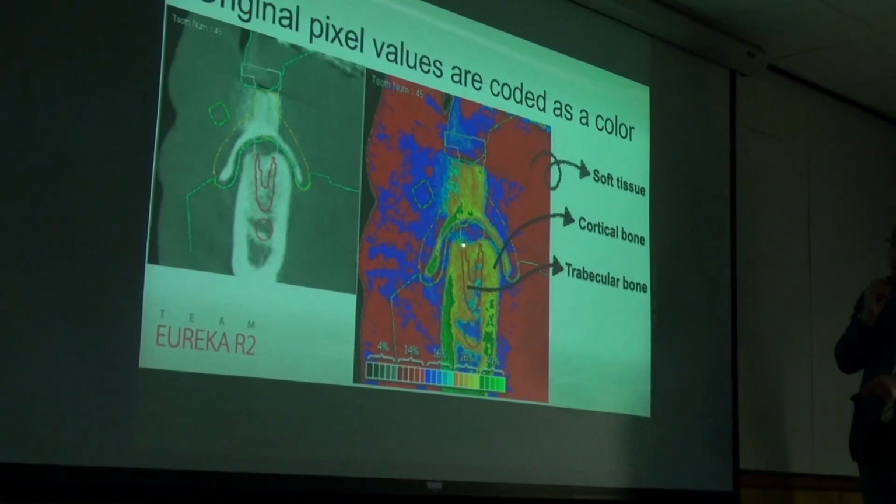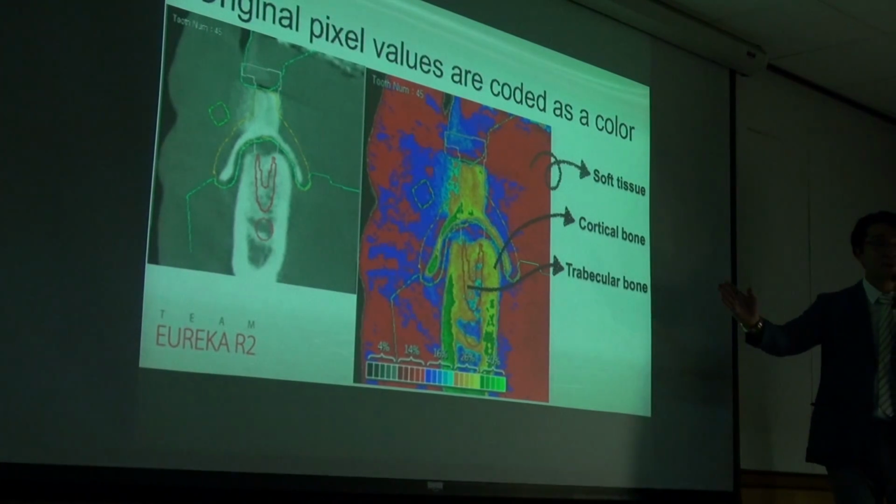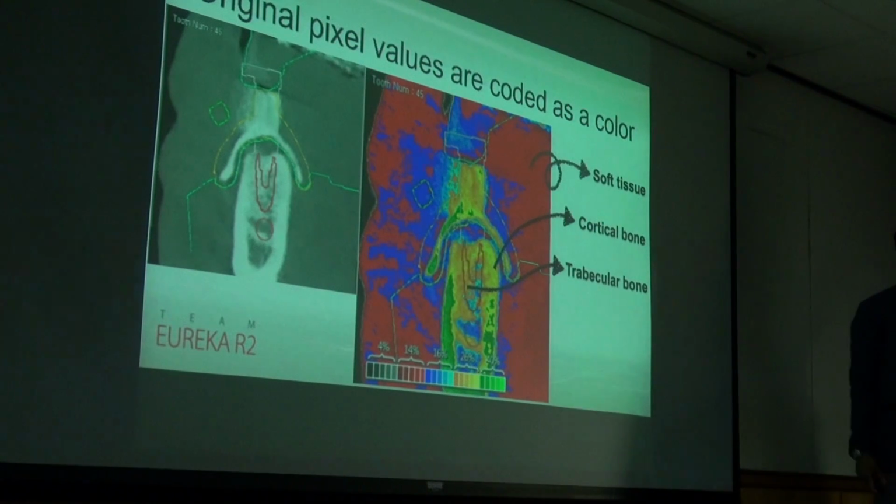Especially, look at the boundary of the implant surface. Almost the whole implant boundary is in contact with the yellow color. It means we will place this implant in very hard bone. Okay, this patient's bone is very hard. How about your drilling strategy?